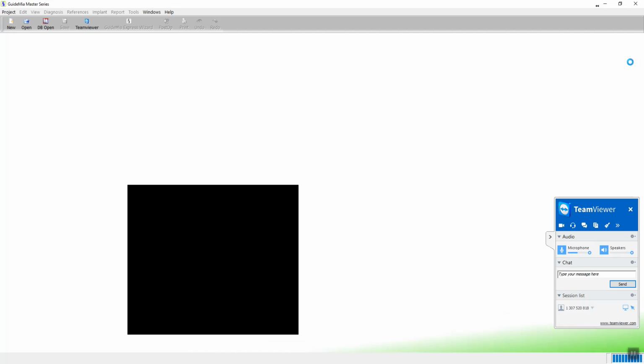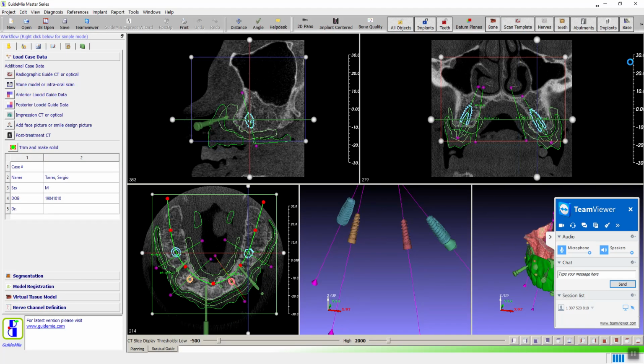Now, while we're waiting here, Frank, the free version of the software, that does everything except print the surgical guide? No, that one doesn't have the functions to process STL files, registrations. Okay, so can they bring in a plan or bring in a CT? Yeah, you can bring a CT to the treatment planning. Then it can open the project files you create. I mean, the technicians create. All right, so we have to send them a project file.